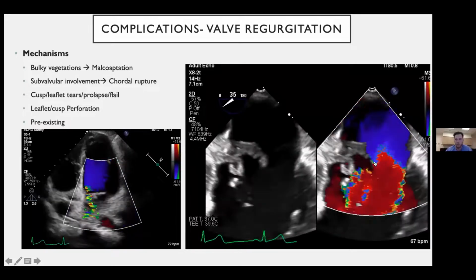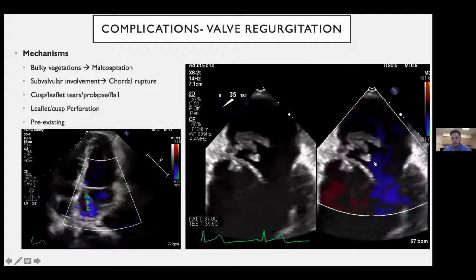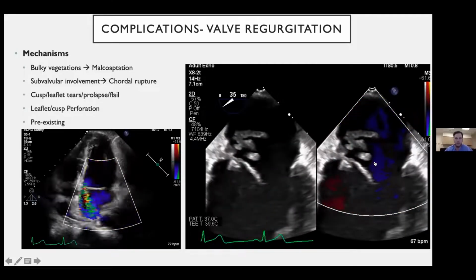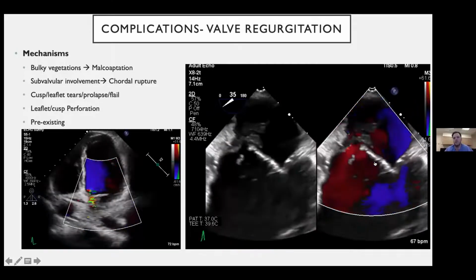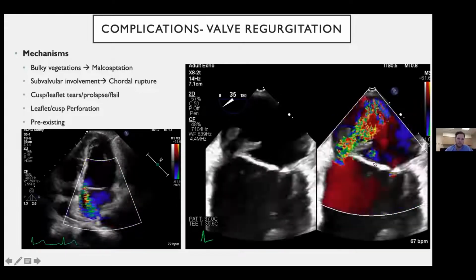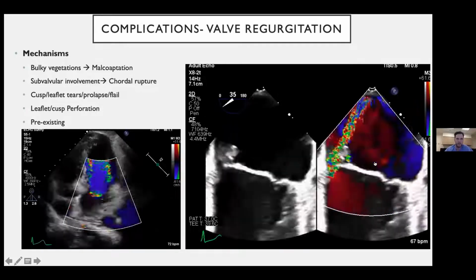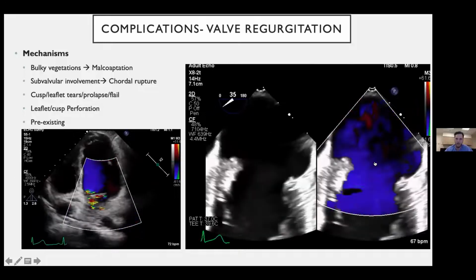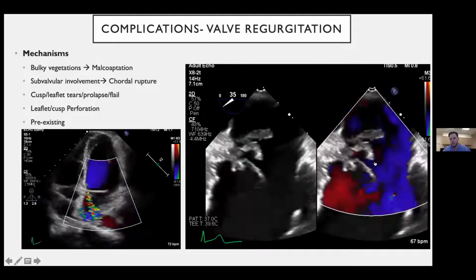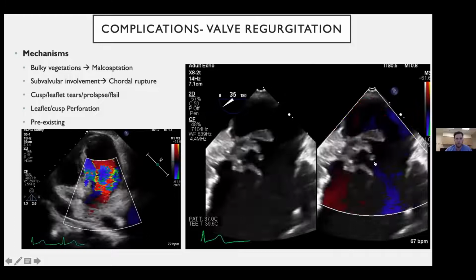example of a young woman who I think many people on the call might know of clinically. She delivered a baby by C-section and was diagnosed with chorioamnionitis. Unfortunately, she became bacteremic, and I think it was group B strep. So the transthoracic is seen on the left here. And what you see is mitral regurgitation in a non-commissural location. And the non-commissural location should really raise red flags that there's something funny going on here. In the context of GBS bacteremia, very, very suspicious for endocarditis.